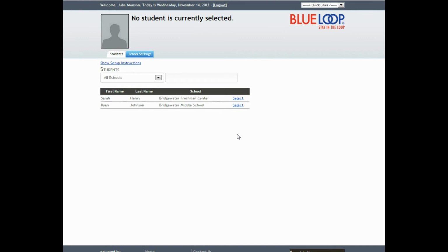So you've now seen a demonstration of how BlueLoop works and how you could use it in your school to have better communication both within your school, with doctor's offices, and with your families of children who are affected by chronic conditions. As I've said, one of the reasons I created BlueLoop was to have better communication with my school nurse, as well as to know how Sarah was doing when she was not with me throughout the day.